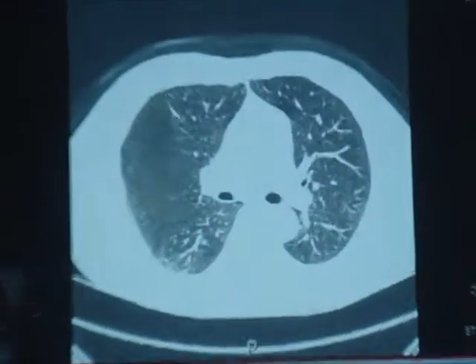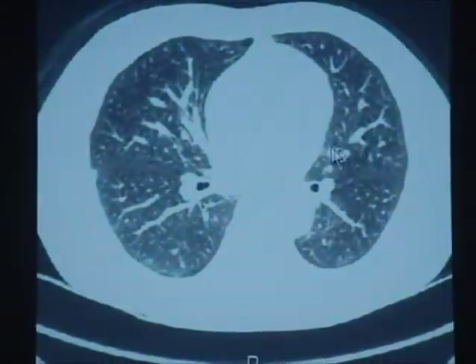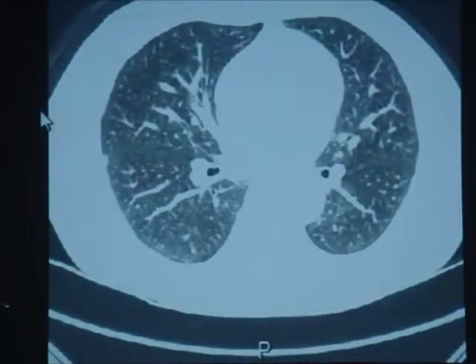Let's follow the left. Okay, it's the left upper lobe bronchus and the left lower lobe bronchus. And these are the lungs, one right side and the left. And I've told you before, these are branches of the pulmonary artery, majority of them.